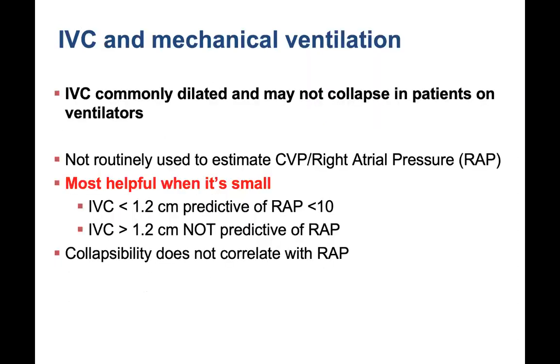So remember, again, IVC is commonly dilated and may not collapse in patients on ventilators. So while I can say with a lot of confidence when the IVC is small that they will respond to fluid, it's a little harder to say with complete confidence that they won't respond to fluid. And it's not necessarily used to estimate CVP and right atrial pressure if they're ventilated. And again, it's most helpful when small.